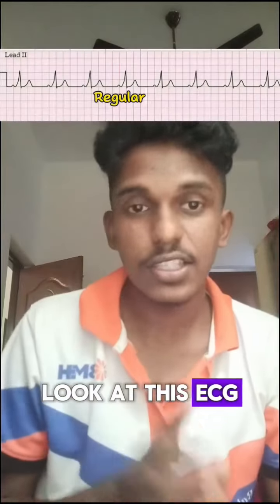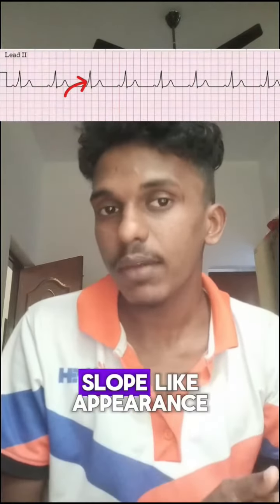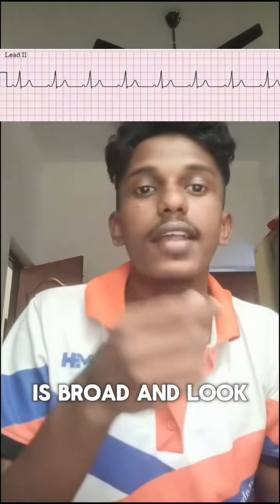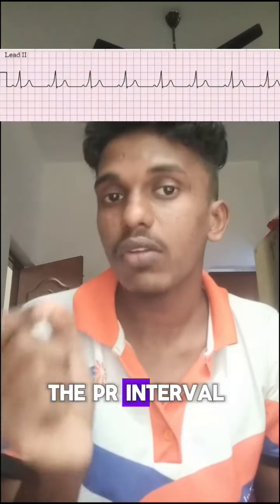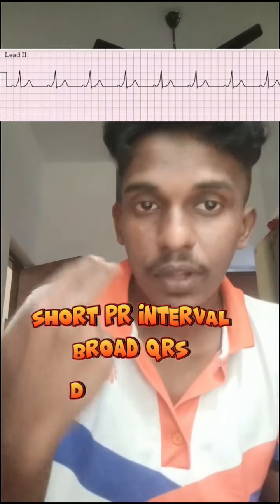Look at this ECG. At the beginning of the QRS complex, we can see a small slurring or a slope-like appearance, and this is known as the delta wave. The QRS is broad, and look at the PR interval. The PR interval is very short. A short PR interval, broad QRS complex with the presence of a delta wave.